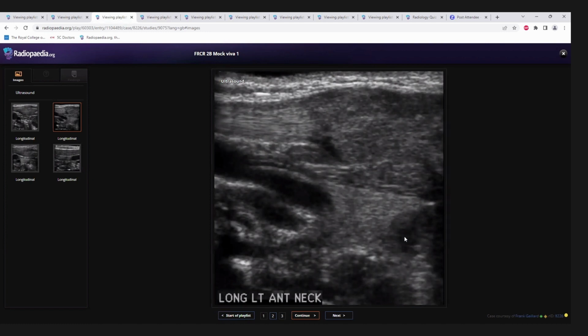All right. Now this case, as you rightly picked up, let me let you know that they do not label which area the ultrasound is being done. History they may provide. You have to ask whether it's a neonate, whether the patient has presented with torticollis. Now, this is again a spotter. So basically, this is fibromatosis coli.